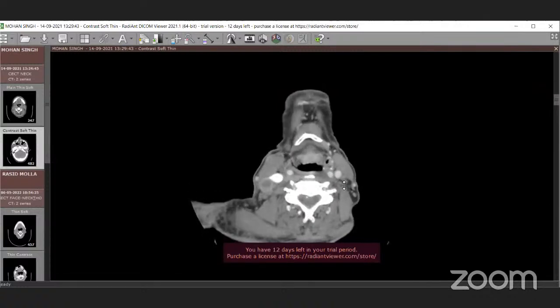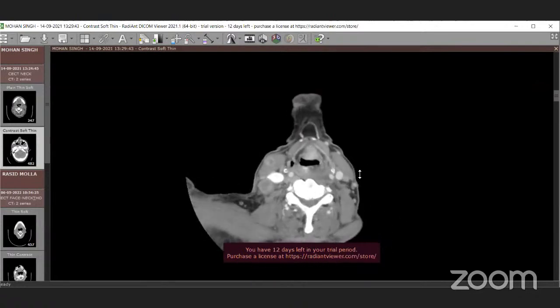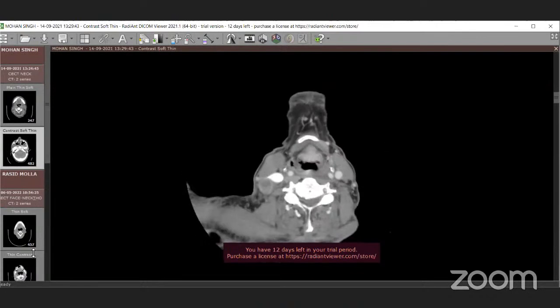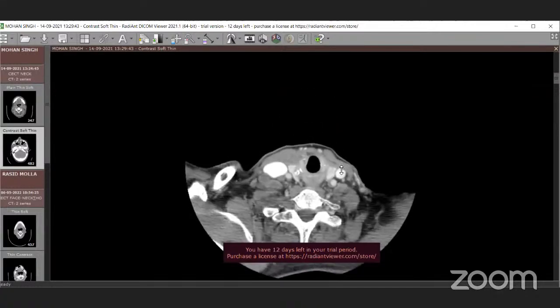Okay, next question, sir. I think we are done with the oropharynx because you have already shown the soft palate and alveolar part in the first class. So I will move to the hypopharynx. Could you please show us the hypopharynx boundary in both the coronal and axial sections, from where to where we designate it as hypopharynx, and what are the structures that are involved?